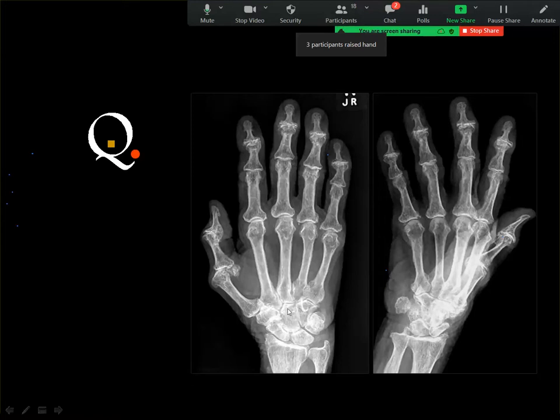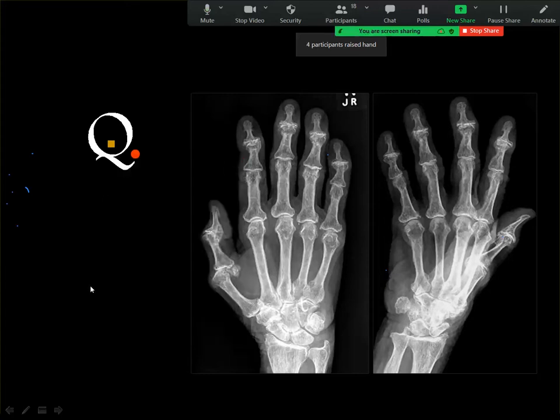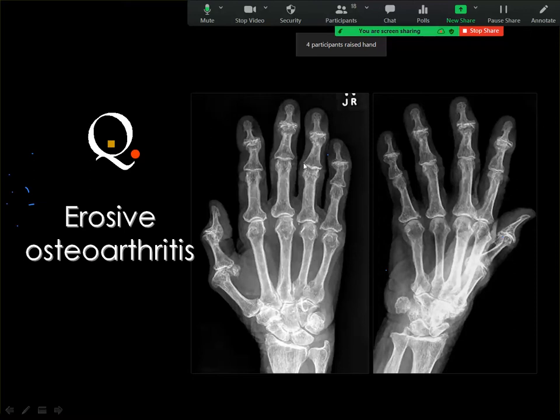Please answer quickly so that we can give you the time. And psoriasis, no. And another possibility, degenerative arthritis. Yes, osteoarthritis of the interphalangeal joints, and this is a right answer, or the erosive osteoarthritis, which simulates birds in the sky, as you all know.